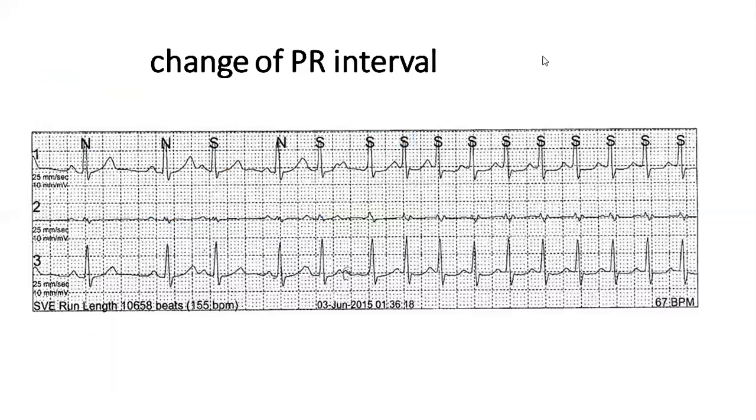I'll show you this. So you have a sinus rhythm here. This is a Holter. This is an ectopic, an atrial ectopic, PR normal, sinus beat, ectopic, and then this is a tachycardia which starts with this beat, right?